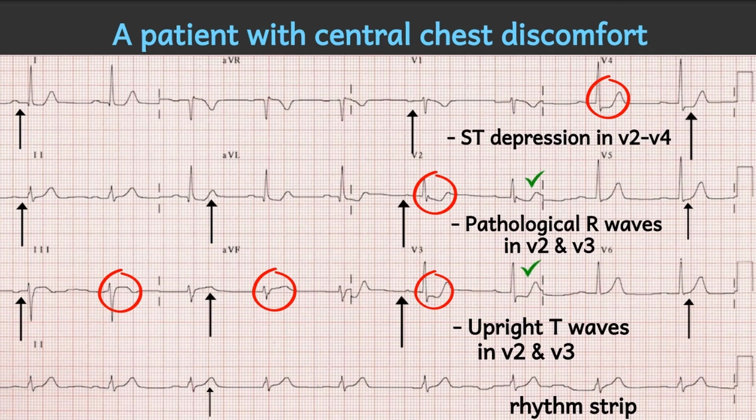And so if you put the posterior leads on this patient, you realize that this same patient would have ST elevations in V7, V8, and V9. And so adding this up, this shows that this patient has a posterior MI, evidenced by the changes we discussed, and probably has an inferior MI with a posterior wall involvement, if you will.